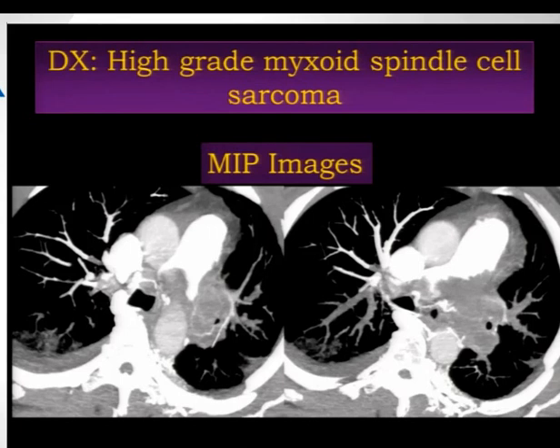One of the things that was also disturbing about this particular case is that it was bilateral. This patient was basically sent home to die. But I felt rather poor, because being an experienced thoracic radiologist, to make such a mistake was quite humiliating. But again, I think these things can happen to anyone, and looking again at this patient, the enhancement in the pulmonary artery is helpful.